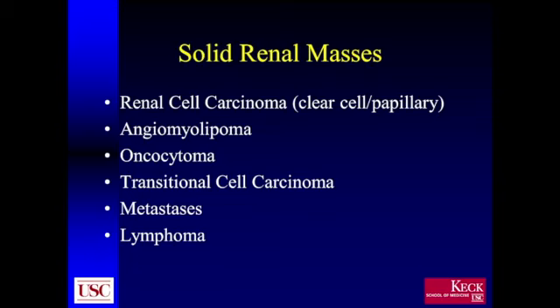When it comes to renal cell carcinomas, there are two common types. There are others, but the two most common types would include clear cell versus papillary carcinoma. And there are relatively suggestive or specific features that with contrast ultrasound we should be looking for to differentiate between the two.